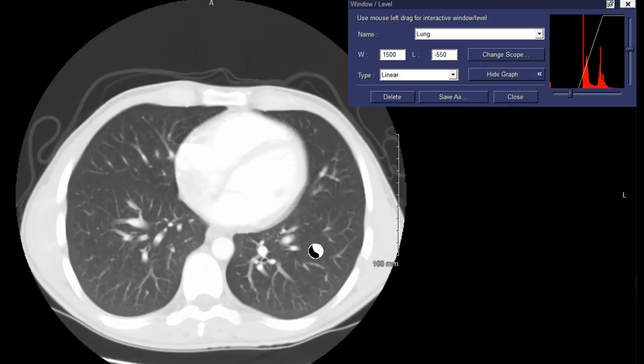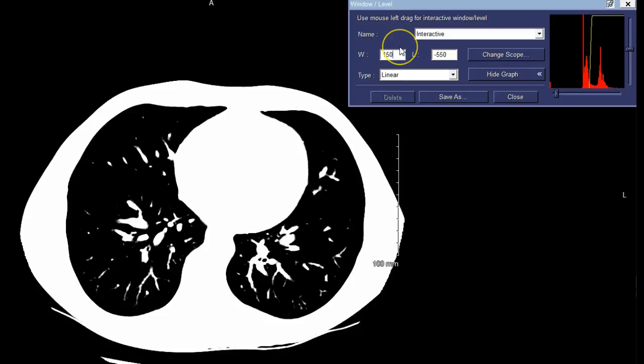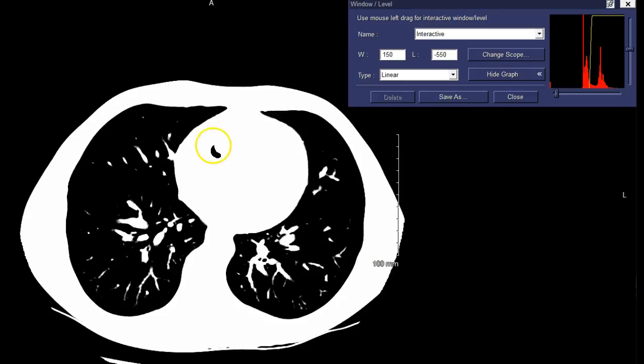Let's go off the defaults to further convey what's really going on. Say that we want fewer grays, so we want more black and white. I'm just going to get rid of a 0 and show you how dramatic this change is going to be. Look at that. We have a lot of very high-contrast structures now visualized within this data set. Essentially all of the structures turn either black or white.